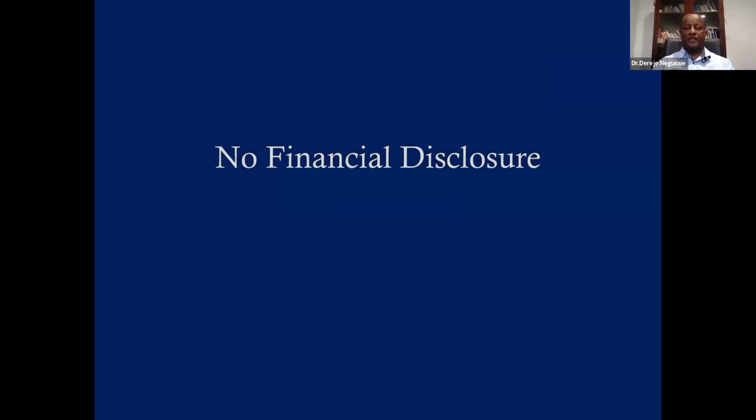Okay. Good evening, everybody. Thank you, Dr. Sadin, for your nice introduction. Thank you, Dr. Jibat, for your class on the filters and OCT. Now I'm going to start real life OCT. As you all know, these days we do have OCT in Ethiopia, especially in Addis. So most of our ophthalmologists have now started to practice it.